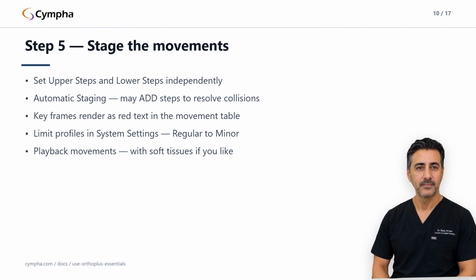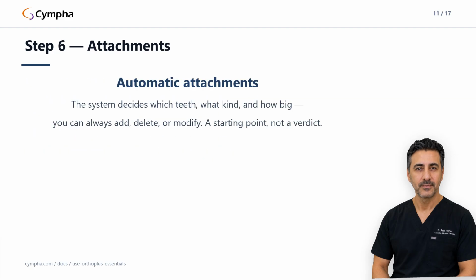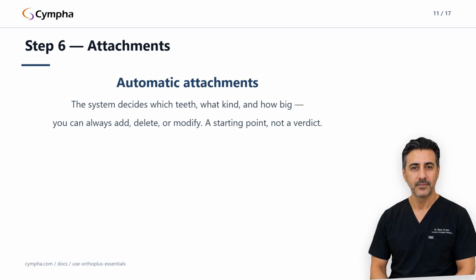Review by playing the case. Playback movements, or playback movements with soft tissues to watch the gingiva follow. And if something reads wrong from a step onward, you don't restart. Plan from step replans from an arbitrary step forward.